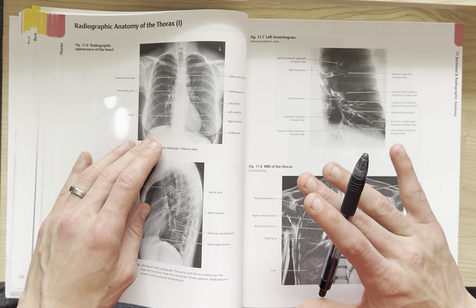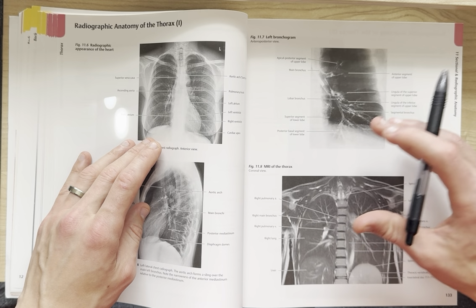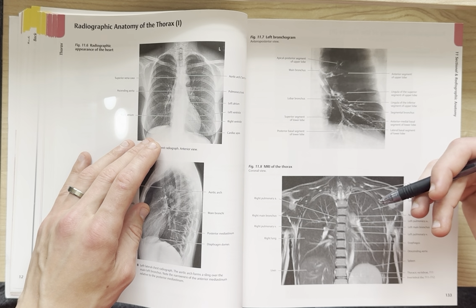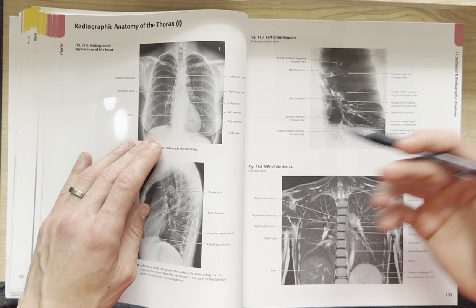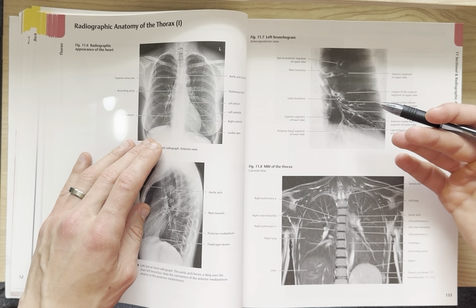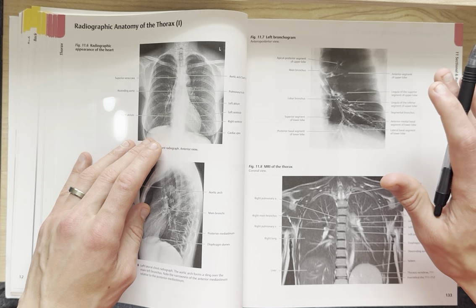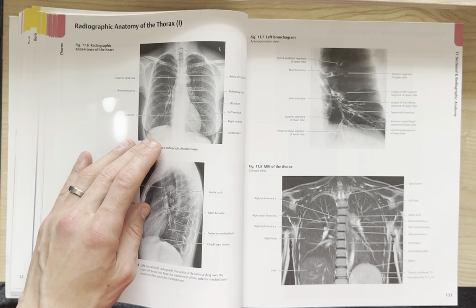It's a process more complex than what I can get into in this video, but just to give you a general idea of how they get the imaging, there's no usage of radiation. It's just a very, very powerful magnet, and because of that, if patients getting an MRI have a pacemaker, they have to have the pacemaker approved. If they have any kind of implants, those have to be approved, which most medical devices that are inserted now are, but every so often, you just never know. So they always double check for that reason.